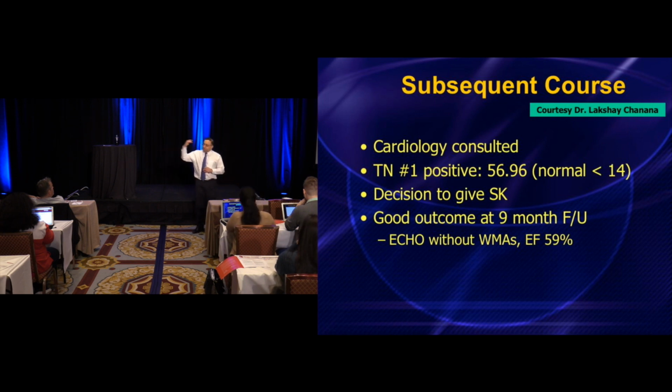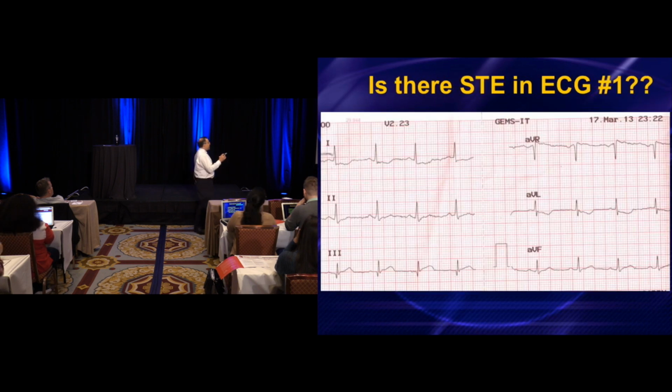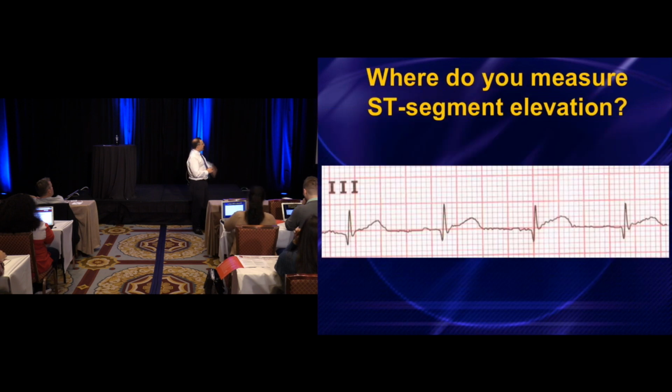Cardiology got consulted. They agreed with the decision. Troponins are positive. The patient's pain improved. Everything went well. But it's a nice case to start with just to talk a little bit about ST segment elevation. Now, this was the first 12 lead that I showed you, and I even focused in on lead 3 and asked you, does lead 3 have ST segment elevation?